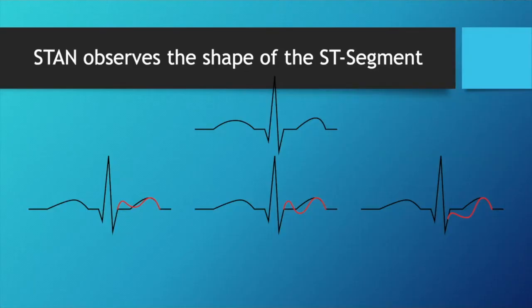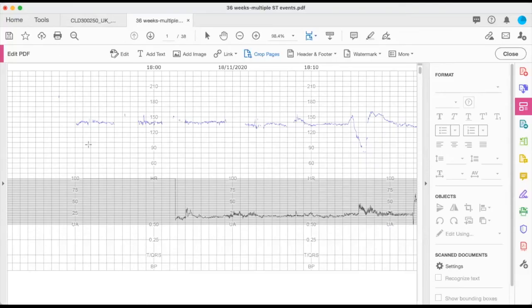Okay. Now, how do we interpret this? This is what the changes look like. This is what the machine is looking for. How are we actually interpreting this? Okay. How do we apply this into real practice? Are we okay so far? Are we still following? Yeah. Cool.